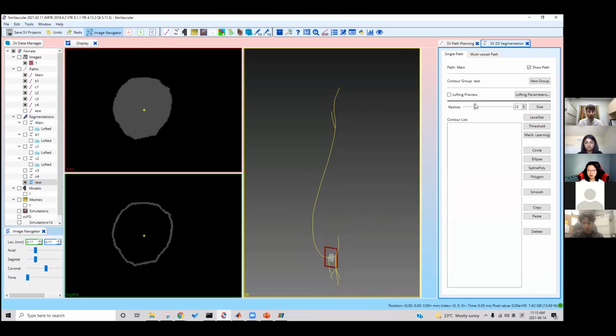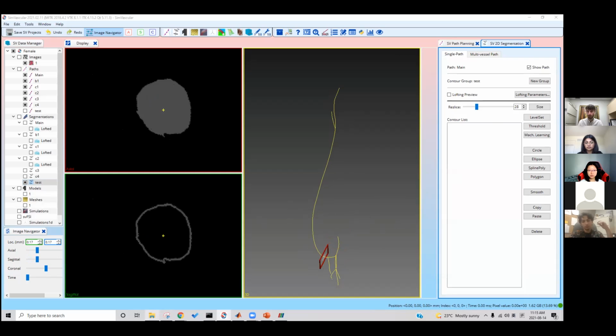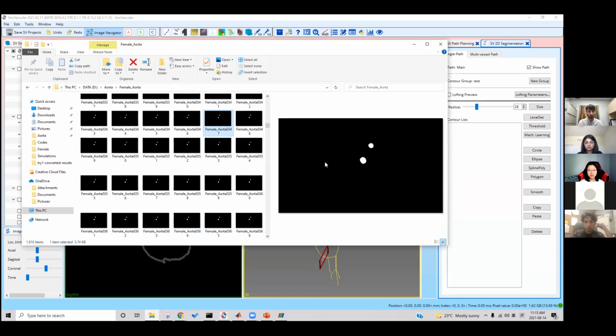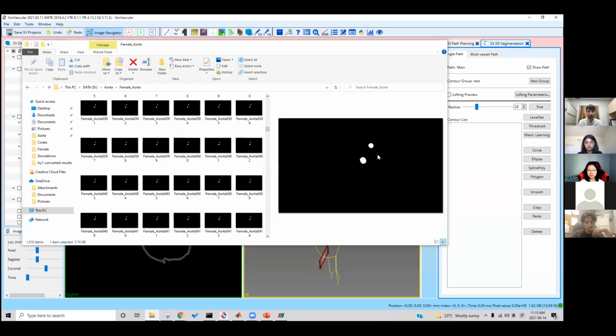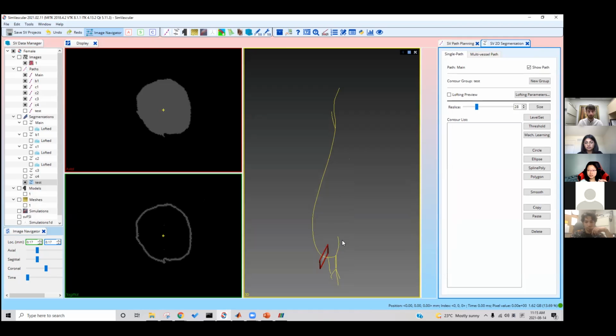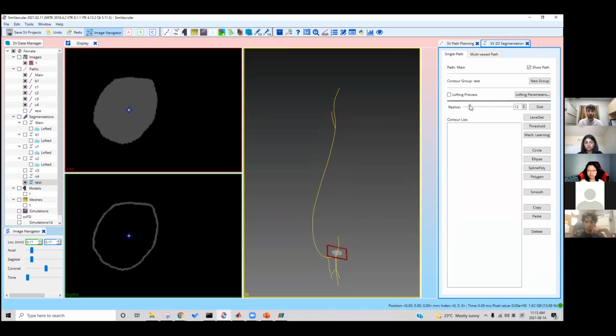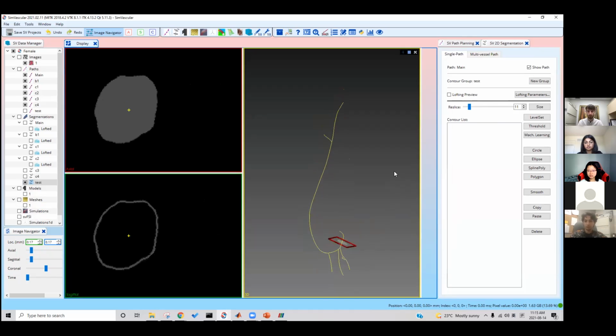So remember how with this, you're gonna have some places where it's not gonna segment very nicely. It's gonna have separating points and everything. But here, because it always segments perpendicular to the center line that you have drawn, you're gonna always have a nice cross section of the blood vessel that you're working on right now. So as you can see, even here it's definitely reslicing at a different angle, but it's perpendicular to the center line. So you're still gonna have a nice circle-ish cross section here.